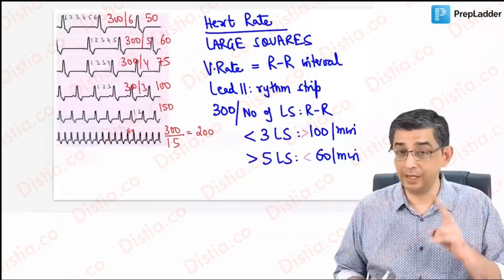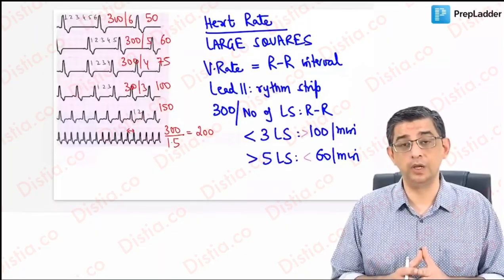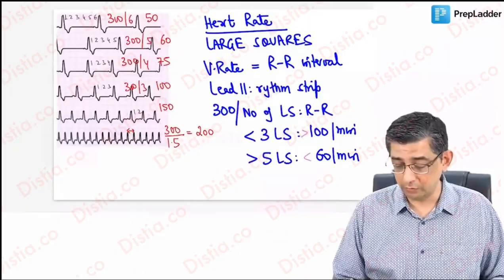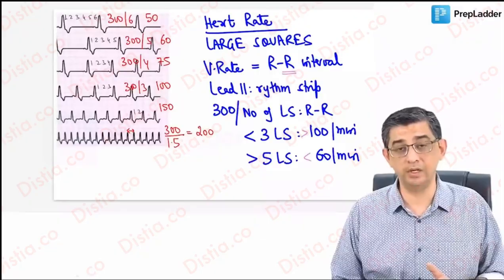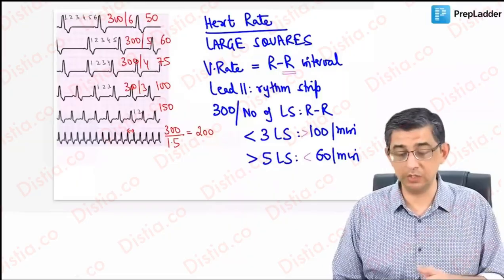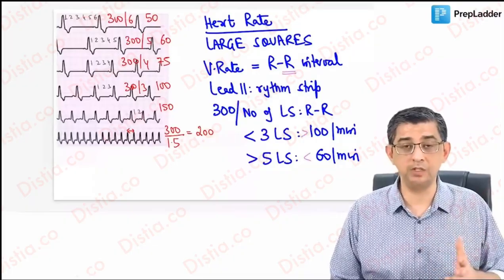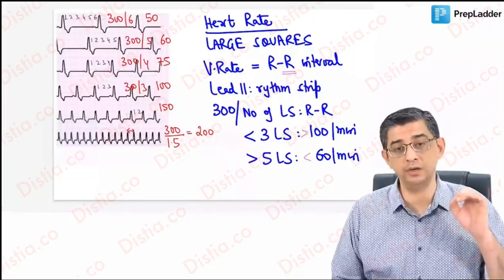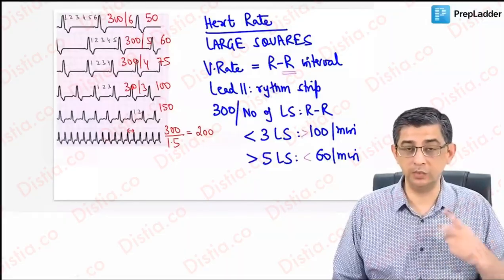Check out the heart rate at least twice, because I'm going to teach you conditions where there's going to be an irregular RR interval. If you miss this point, I'm going to say this again, guys. Don't check the RR interval only once, because lots of times there could be an ECG of atrial fibrillation and multifocal atrial tachycardia where the RR interval will be changing. If the RR interval changes, you just can't say by counting only one time, okay, this is the heart rate, because it is variable. And these are two arrhythmias where we get an irregular pulse per se. I'm highlighting the question right away. It could be a 3-liner, 4-liner. The key word is irregular pulse. Two times you're going to read it.